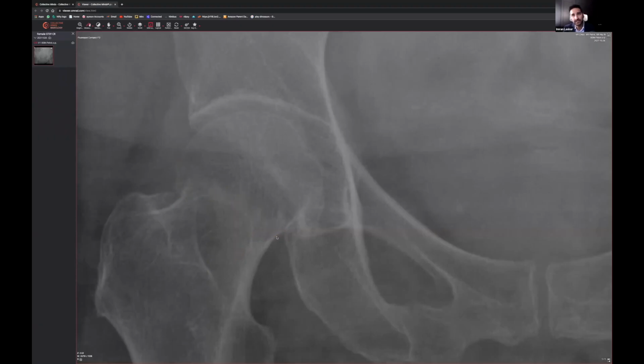So what you actually have here is not only a neck of femur fracture on the right side, it's an impacted neck of femur fracture on the right side, which, believe it or not, does get missed. And I will show you, I've got some really great cases of bone lesions, et cetera, that will help us understand the whole thing. I'm talking about the trabeculation, the bone density, and the bone texture as well as time goes on.